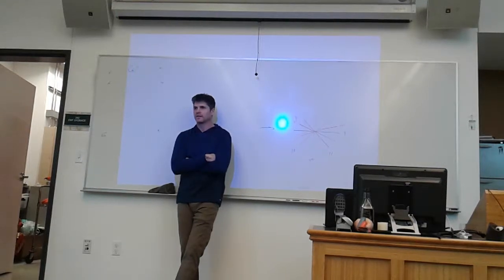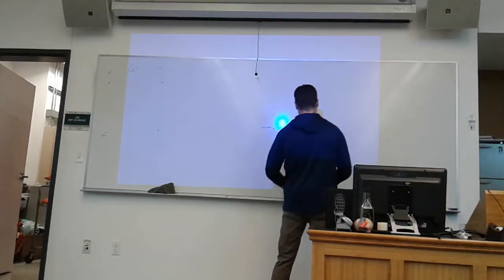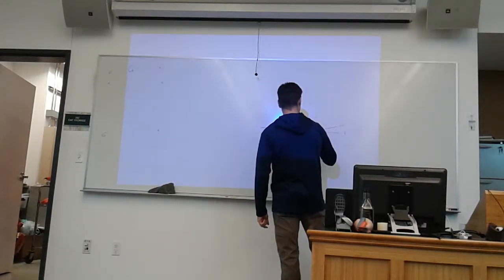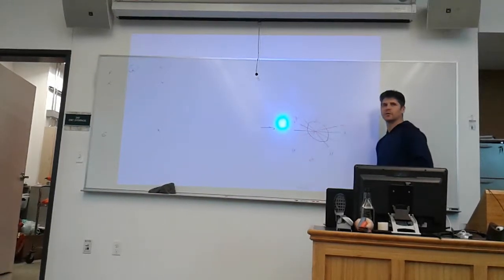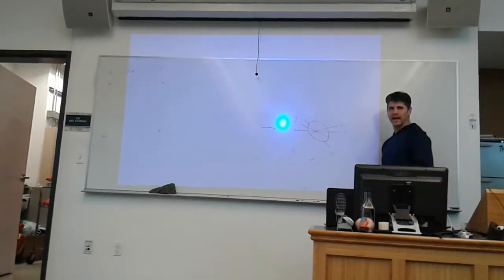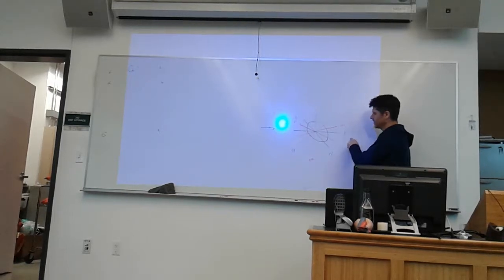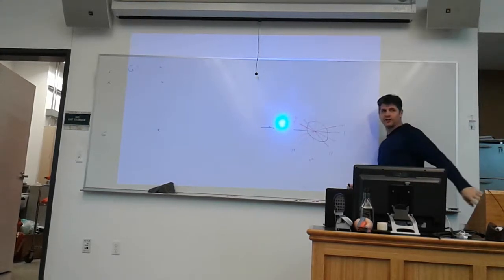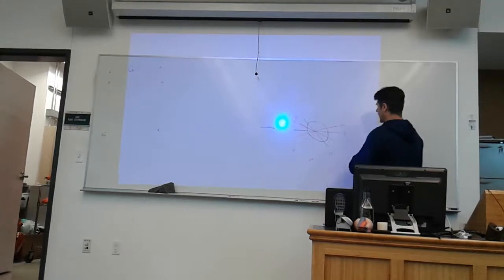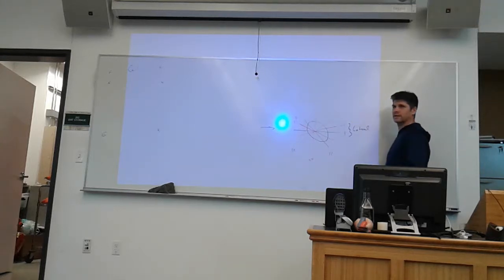Those leads and understanding what they're looking at, right? So if I put the heart over this, then we're trying to determine what these are actually looking at, right? So these leads look at what part of the heart? The side. Yeah, they look at the side of the heart. In medical terminology, that is called lateral. So these look at the lateral part of the heart, right?